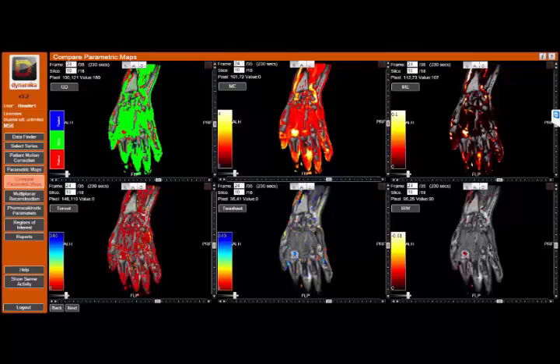So these are the most severely affected, or in other terms, inflamed areas. It also corresponds quite well with a high initial rate washout. You have washout, as you can see on the red colors here in the gadolinium map.